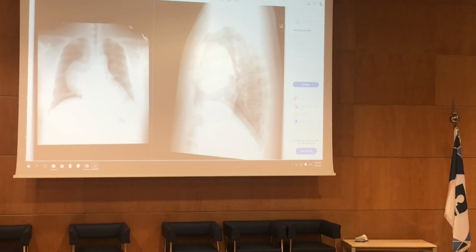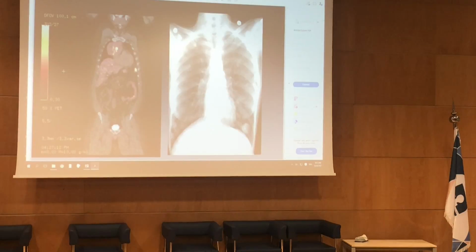Okay, this patient has a mediastinal mass, right, to the right side, and mainly anterior. It's obliterating the anterior mediastinum as well on the lateral view. Okay, so this is a right atrial enlargement because it's involving the right side of the heart. Now I have way exceeded the time.